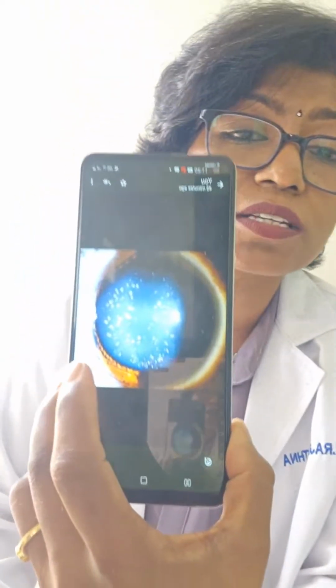What were the options? Zonular cataract? No, zonular cataract will be like a cart wheel. It will have a wheel-like appearance, a central disc and spokes from there. So it is not zonular cataract. Cuneiform cataract will have peripheral wedges. These are just dots. Rubella cataract will be a very pearly cataract, or it can be a very membranous appearance. Okay, total cataract. Blue dot cataract, also known as punctate cataract or cataracta ceruleum punctata or cataracta punctata ceruleum.